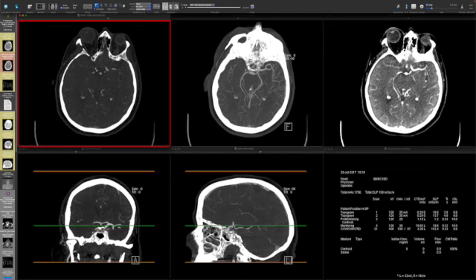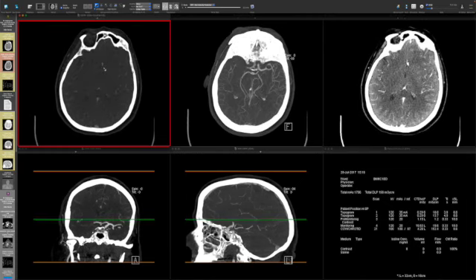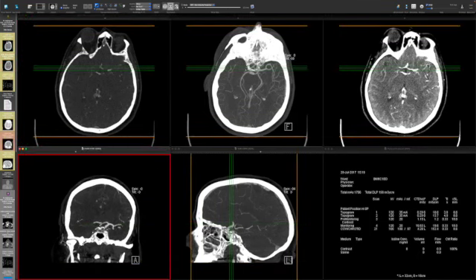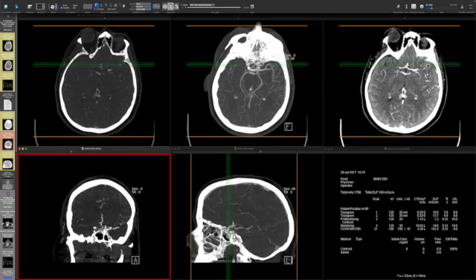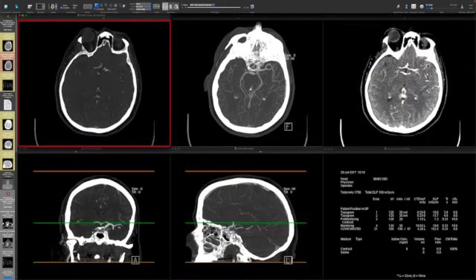You'll also see that the next thing we're going to assess is the anterior cerebral arteries. So here are the anterior cerebral arteries on the left and then on the right. And then we get the anterior communicating artery, which we can see is very small. So the ACOM is actually very hypoplastic. Either that or it's absent. So we can't really see it, but you can see the A1 branch on this side. This A1 branch on the right side is probably filling, presumably retrograde across a hypoplastic ACOM because there's no supply from this right carotid side.